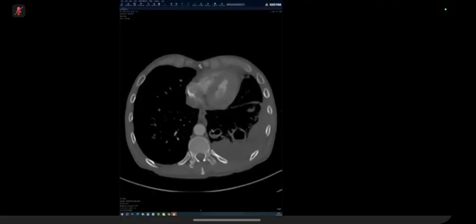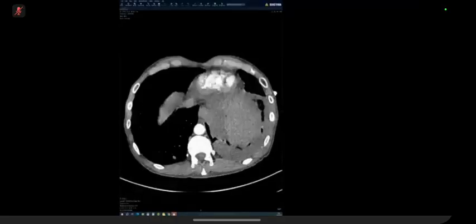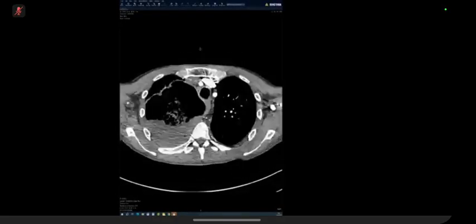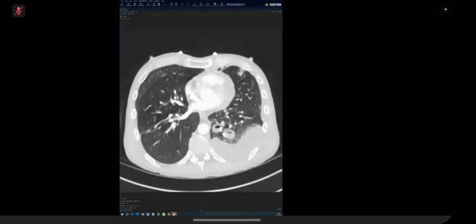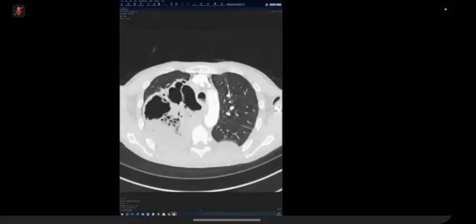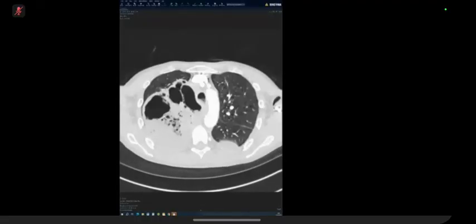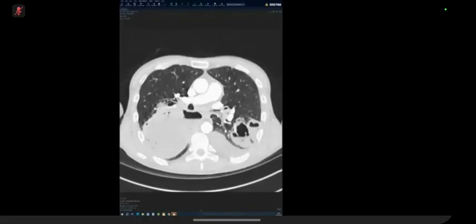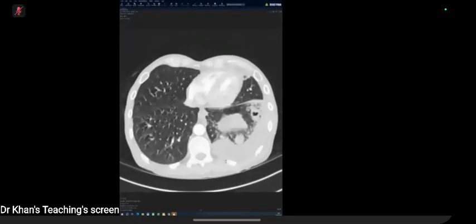So, what's the test of choice to look for endocarditis? I think echo, to see the vegetations. Yes. So you picked the abnormalities straight away, but I think your mind kept going back to TB for some reason again and again. If you don't see the tree in bud, then you need the scarring. The only way this can be TB is if this was old TB and the patient had dead space and that got secondary infection.